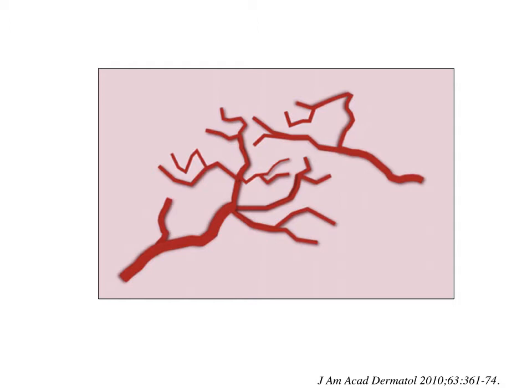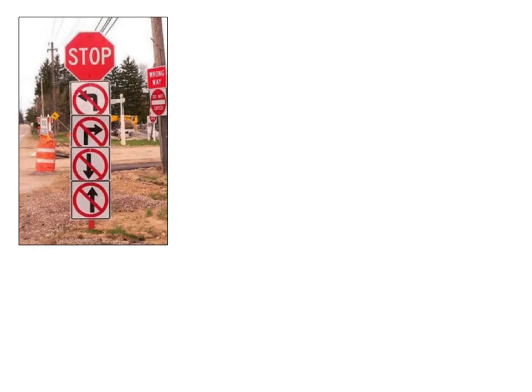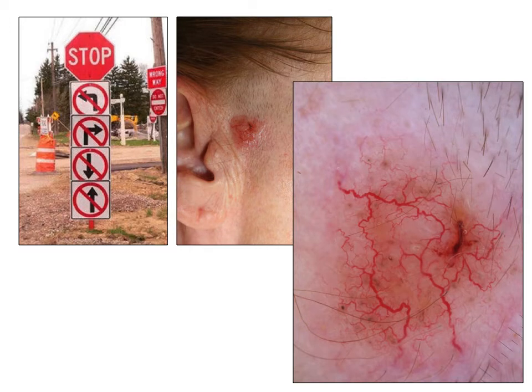In fact, every dermal tumor can produce these tree-like vessels, and it is also the case for squamous cell carcinoma. So again, we have a confusing image. These plexuses can be pushed up by basal cell carcinomas, of course, but also we have seen squamous cell carcinoma, but it's also possible to see the same image in an epidermoid cyst, in dermatofibrosarcoma protuberans, and many dermal tumors.